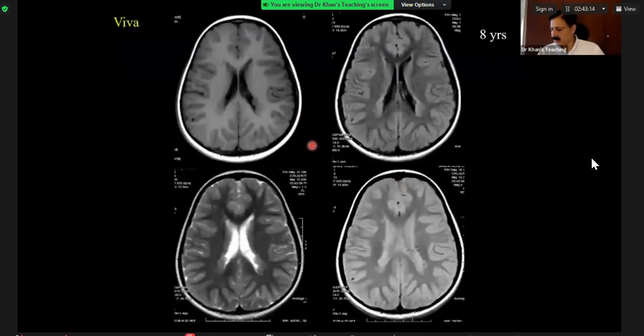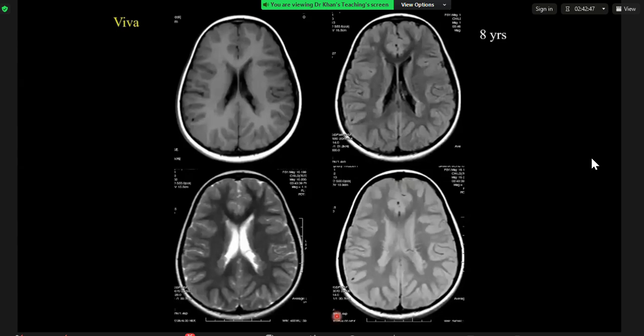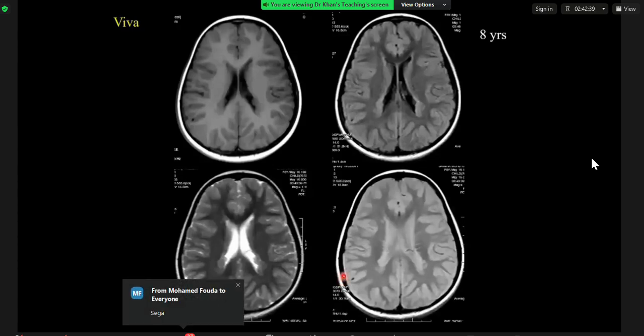Now, another case for you, candidate. So these are selected axial slices through the brain, MRI. On the left, extreme left, we are dealing with T1 here. Then T1, then FLAIR, T2, and this last sequence is FLAIR again? White matter is dark here.